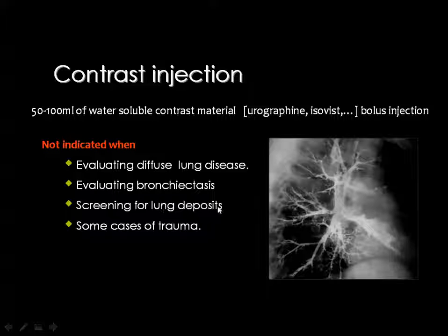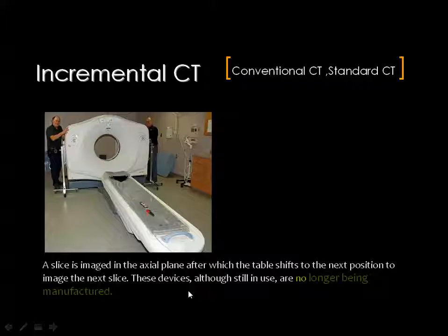Then screening for lung deposits, you don't need to inject contrast, and in some cases of trauma, when vascular injury is not suspected, you may not need to inject the contrast material.